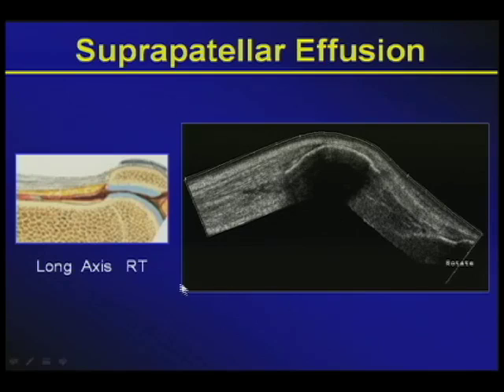Here in a cone down view of Netter's illustration, you'll notice the fibrillar pattern on the distal quadriceps tendon inserting on the patella. And behind it, right after you cross the suprapatellar fat pad, you see fluid in the suprapatellar recess in front of the prefemoral fat pad.